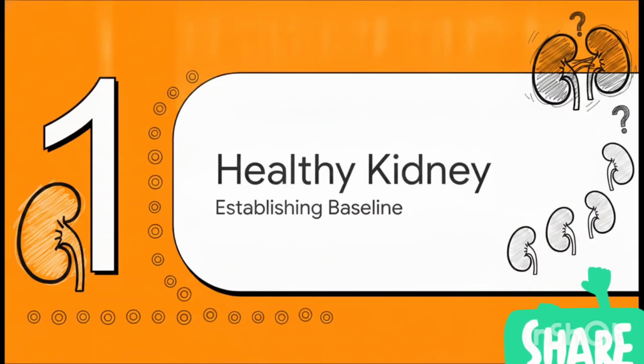Section 1. The healthy kidney: establishing the baseline. You see, to spot disease, we first need to cement what a perfectly healthy kidney actually looks like. You really can't recognize an abnormality until you know the norm.